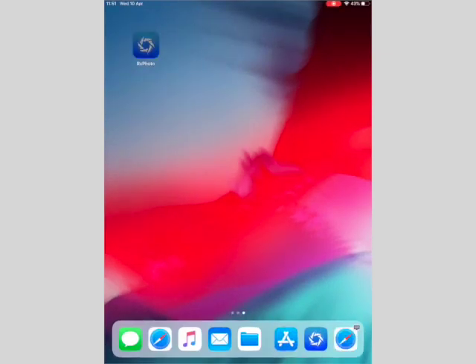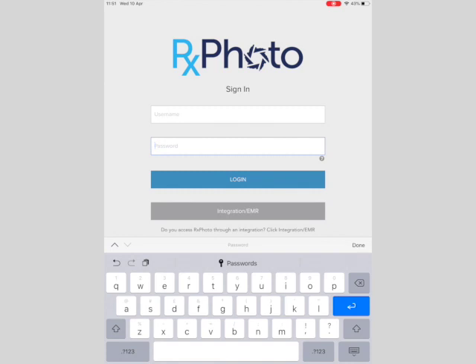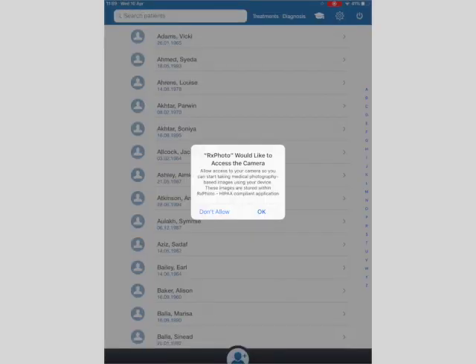And then when you go on the app, you have to sign in. Now, I will send you your username and password. You will have your own username and password. So you have to make sure you're on the EU server. If you have happened to open the app before you put that into the settings, you have to completely close it by swiping it away, and then you have to open it afresh.